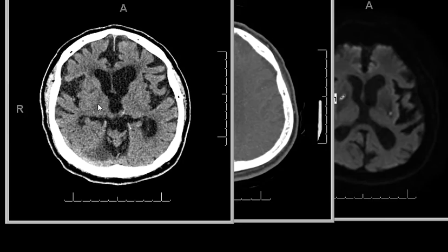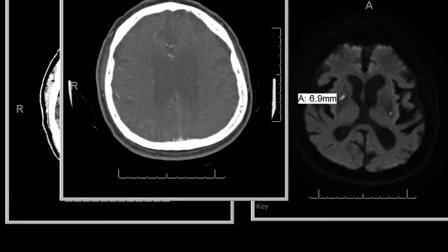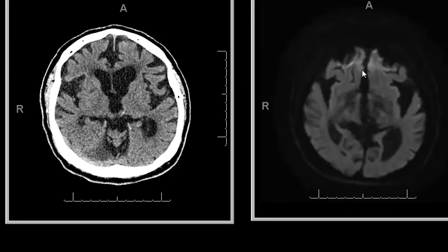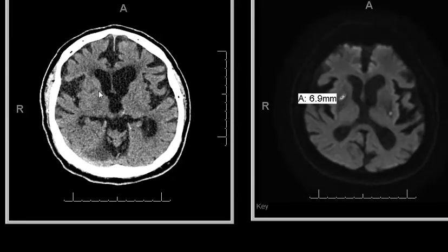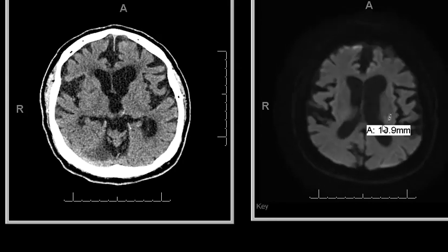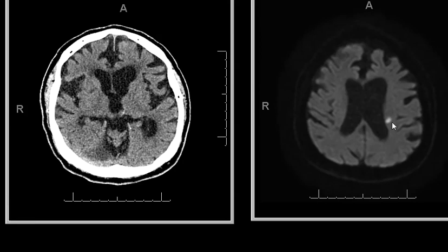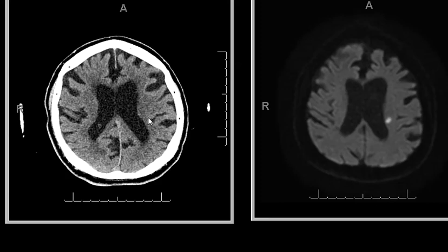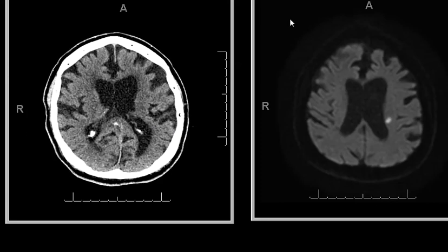It's hard to tell the age, but it could be chronic, and it turns out this one is acute here. The posterior limb internal capsule corticospinal tract lesion here. It's hard to call. And too small for CT perfusion to be detected, and there's no large vessel occlusion. There's nothing to be done interventionally, so this is another case.